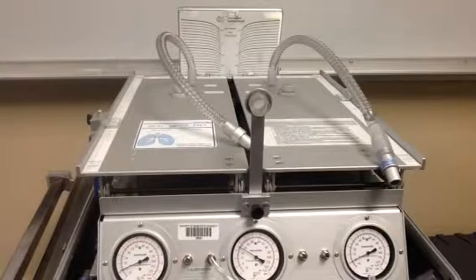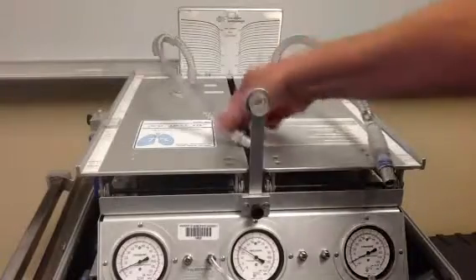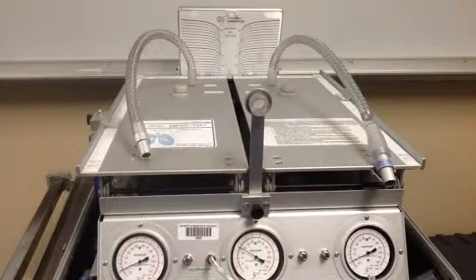Okay, I want to do a little recording for you guys with a test lung. We're going to be changing compliance and resistance on these two lungs that we've got here. Resistance, remember, lives in the airway. So we've got some resistance here. I've got very little resistance in this one. But we're going to be able to do some analysis here of mechanics of breathing.